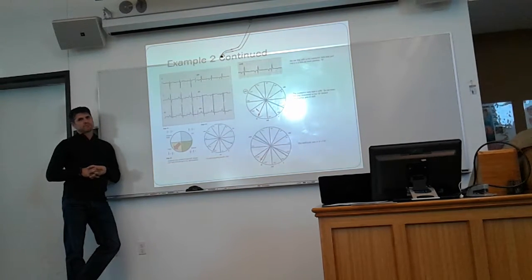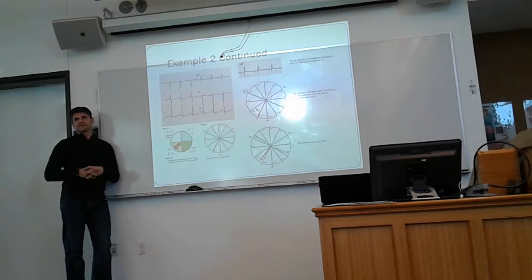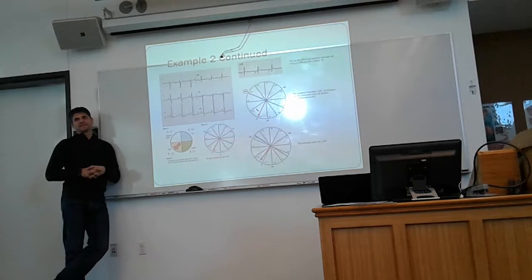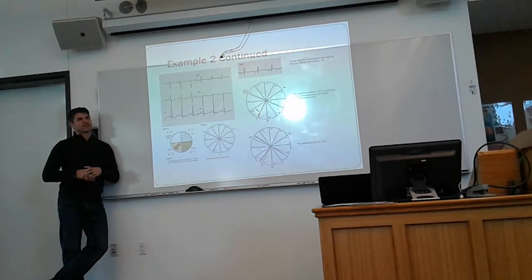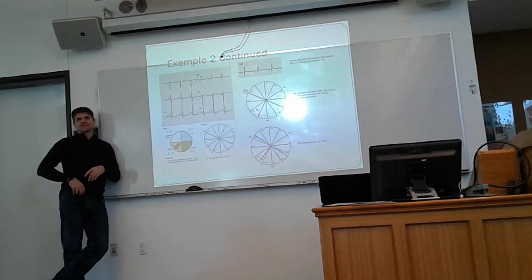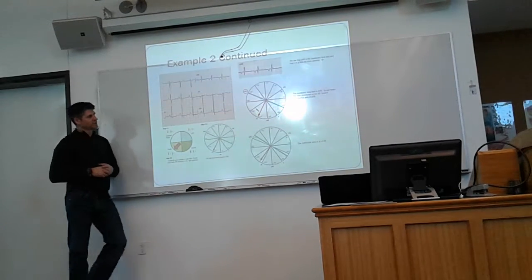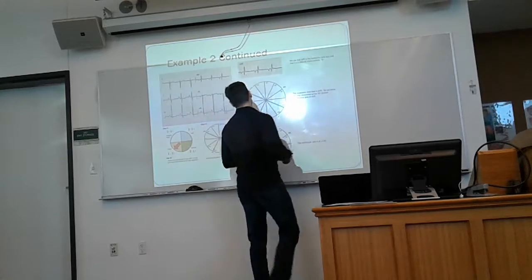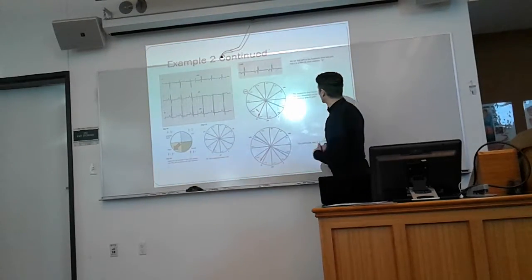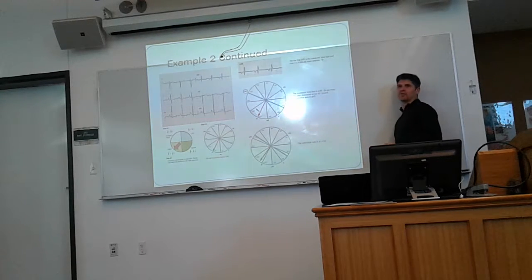Okay, yeah, it's not double, your eyes are better than mine. It's less than one big box on the bottom and greater than one big box on the top. Yes, if we doubled it, it would be two boxes, darn close to 15 degrees. So it's somewhere between 10 and 15 degrees. So we know that it's pointing at 120 degrees, and we're going to shift it by at least 10 degrees. So we would say this is right axis deviation of 130 degrees.